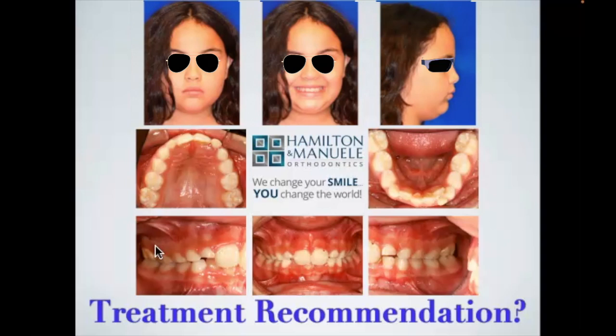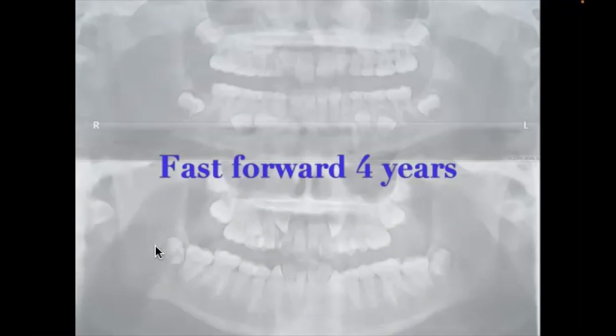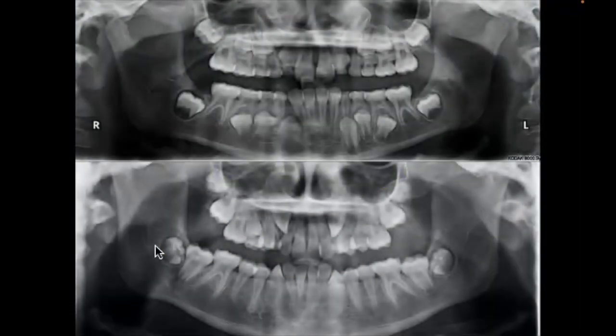What else are you going to do? You've done the expansion, and you take the expander off. What else? Okay, you could do a bite plate to prevent wear, and also to maintain all of the space that you've created, right? So you maintain your arch length dentally, right? Skeletally, after the expander comes off, that bone should be set, filled in with new bone, hardened, all those things. All right, so we're going to maintain the arch length that we have, and we're going to prevent the lower incisors from wearing down with an anterior bite plate or something similar. So that is exactly what we recommended. And so now we're going to fast forward 4 years, and let's see how we did.